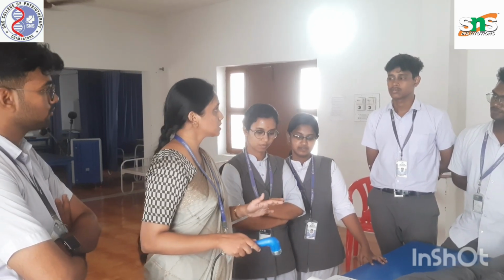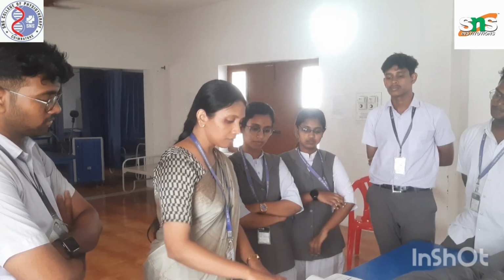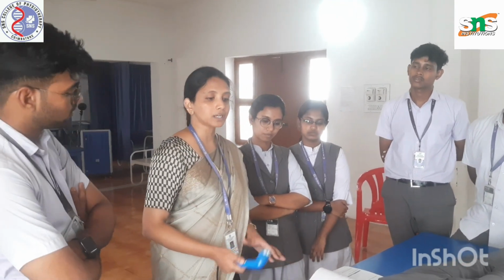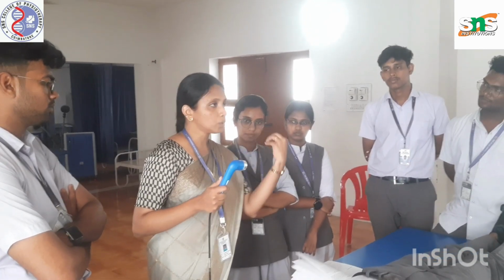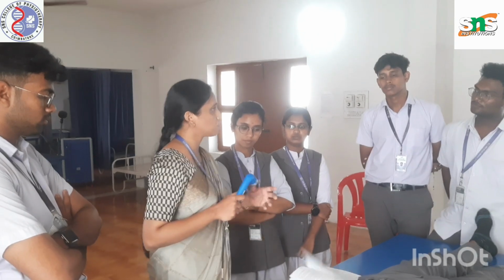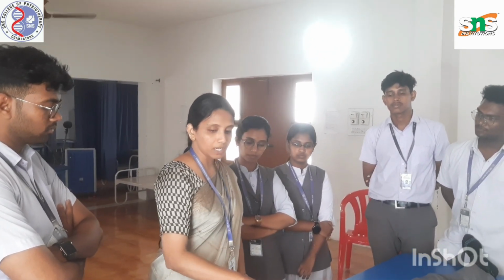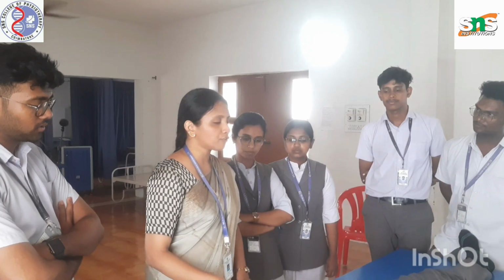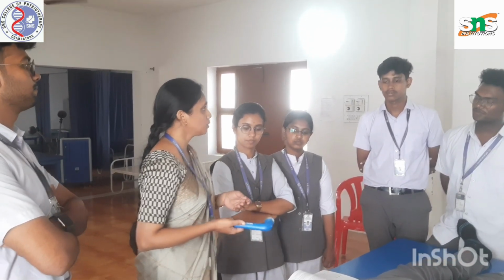Those vibrations will give you a heating effect. Okay. So the therapeutic effect we can expect is primarily pain relief. The ultrasound head will have an ultrasound beam coming out of it. That beam will have a healing effect in medial epicondylitis. The inflammatory process will be healed with the help of the ultrasound therapy.